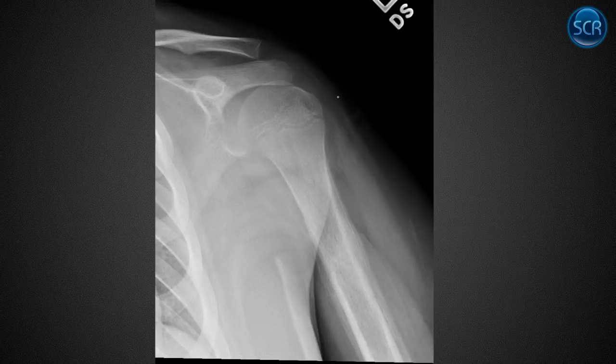This one, we look at this. Glenohumeral joint looks normal. This is a young child, of course. Physeal plate's open. Acromion hasn't ossified yet. All that looks fine. What we're seeing here, again, is a very permeative area of lytic destruction, and then we've got this overlying laminated periosteal reaction both medially and laterally. This child had an Ewing sarcoma of their humerus.